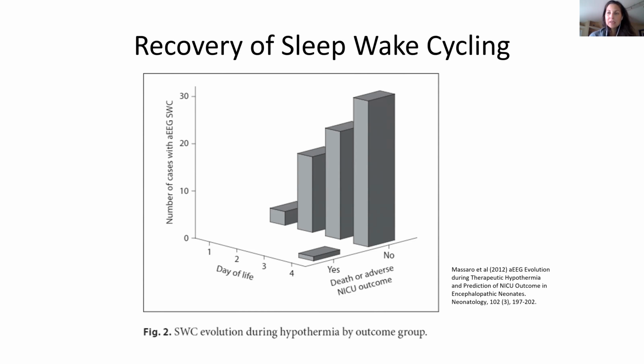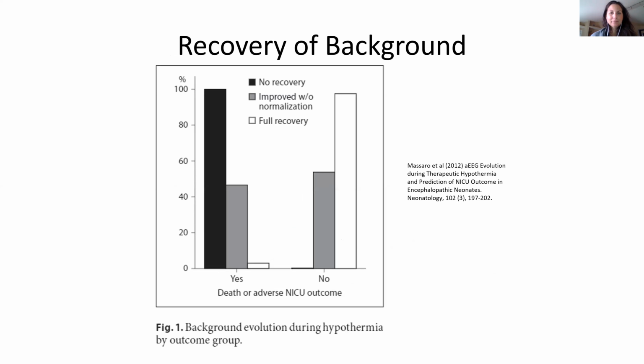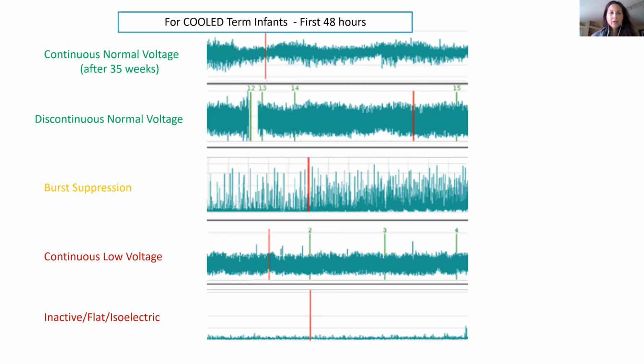How about the sleep-wake cycling? I think it's one of those that maybe we don't talk about as much. So Tess is saying yes. Awesome. And this is the same there. So for cooled babies, remembering those first 48 hours, we're really looking for those continuous and discontinuous patterns to reemerge. Great, yeah. So Polly, you're learning from the best, of course.